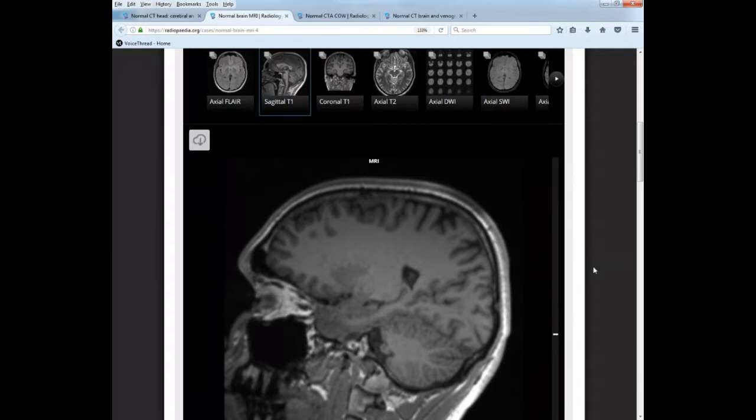And then in the limbic system, we move on to the amygdala, olfactory tracts. You're not going to be able to see the olfactory tracts. The fornix, yes, for sure. Mammillary bodies, yes, for sure. And the pineal gland. So starting with the diencephalon, let's look for thalamus.